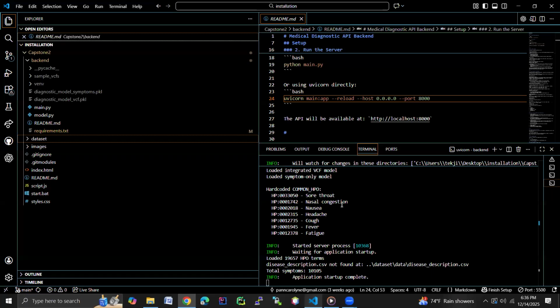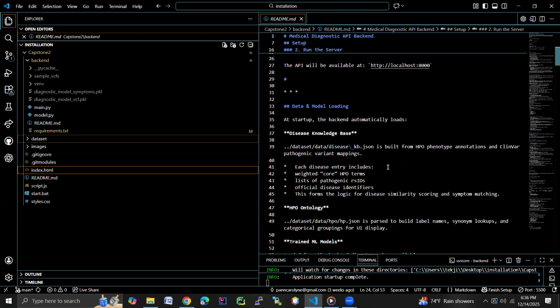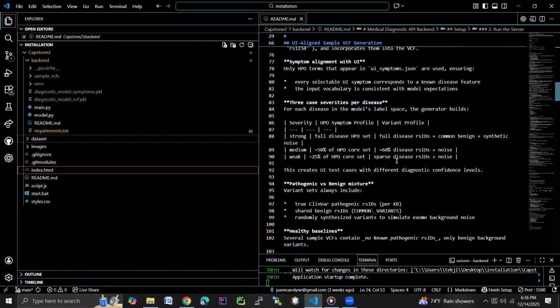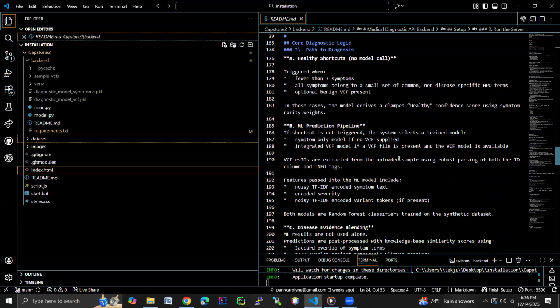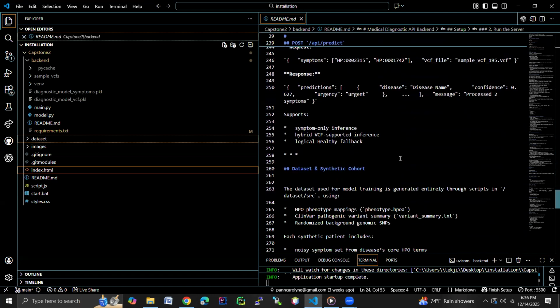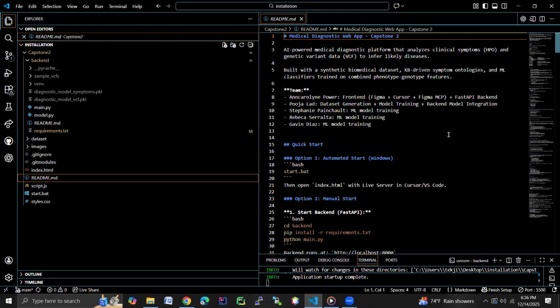Once again, in the case where the user is attempting to install said project and they are in search of some sort of clarification, we have provided detailed README files that hopefully will provide the clarification that the individual is searching for. Overall, this is our installation for the AI Medical Diagnosis Assistant app.